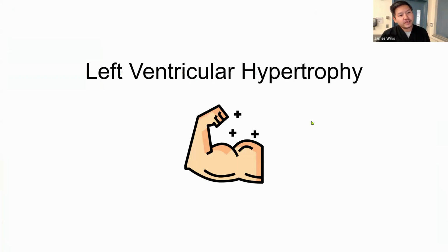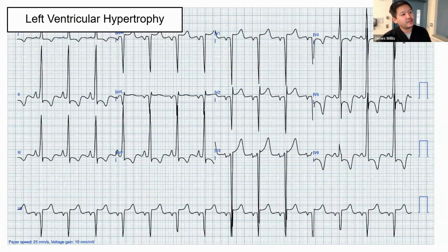So before we go, tell you what happened to this patient, we're going to go over some LVH EKGs, kind of like a very difficult EKG that's tortured me and many attendings for decades. So this patient had this LVH.